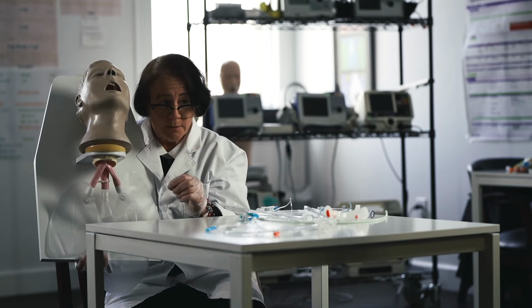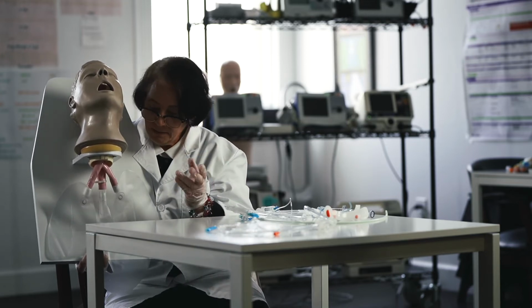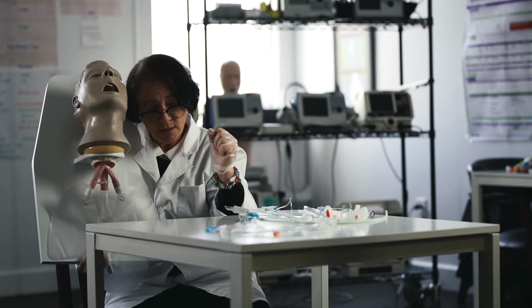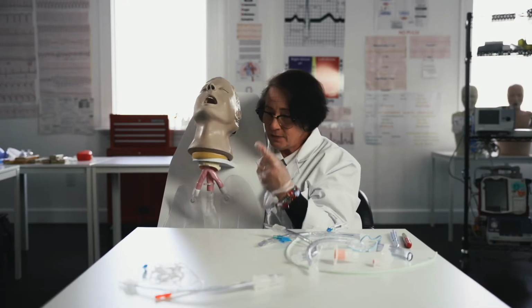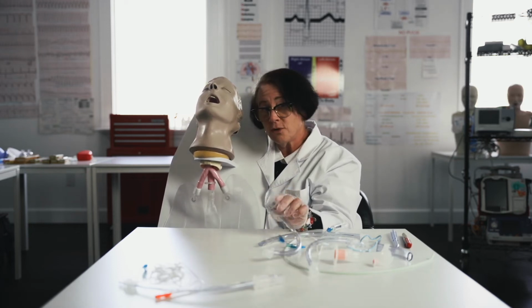If you ever have trouble with a tracheostomy or an endotracheal tube, remember the acronym DOPE. The D is displaced, O is obstructed, probably with secretions, the P is a pneumothorax, they collapsed a lung, or E is equipment failed. But it's one of those four problems. That trach or endotracheal tube is either displaced, obstructed, the P is a pneumothorax, or E equipment failed.